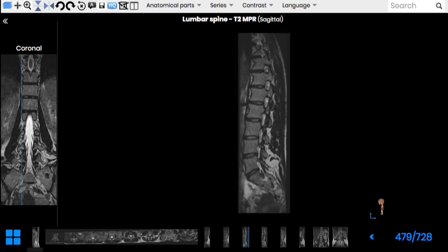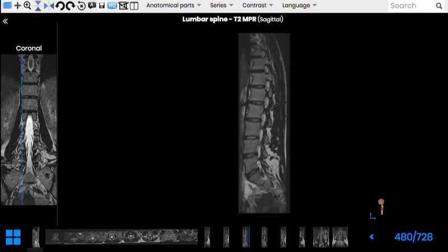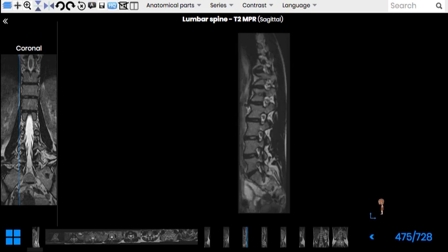Of course, you understand, if the intervertebral disc is damaged, if it is destroyed with age, like in old people, usually they degenerate, or if some herniation of the nucleus pulposus happens, in that case the space between two adjacent vertebrae becomes narrower, and accordingly the diameter of the intervertebral foramen also becomes smaller. That can squeeze the nerve inside and provoke chronic back pain and conditions like sciatica.